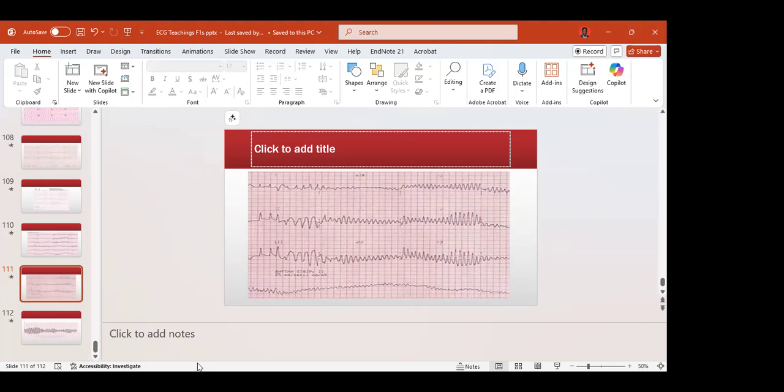But remember that in an ECG, there are major things you're looking at. You have to report the evidence that supports your diagnosis. If you look at an ECG and there's a complete heart block, definitely it is important. You can't leave it out. You must say it.